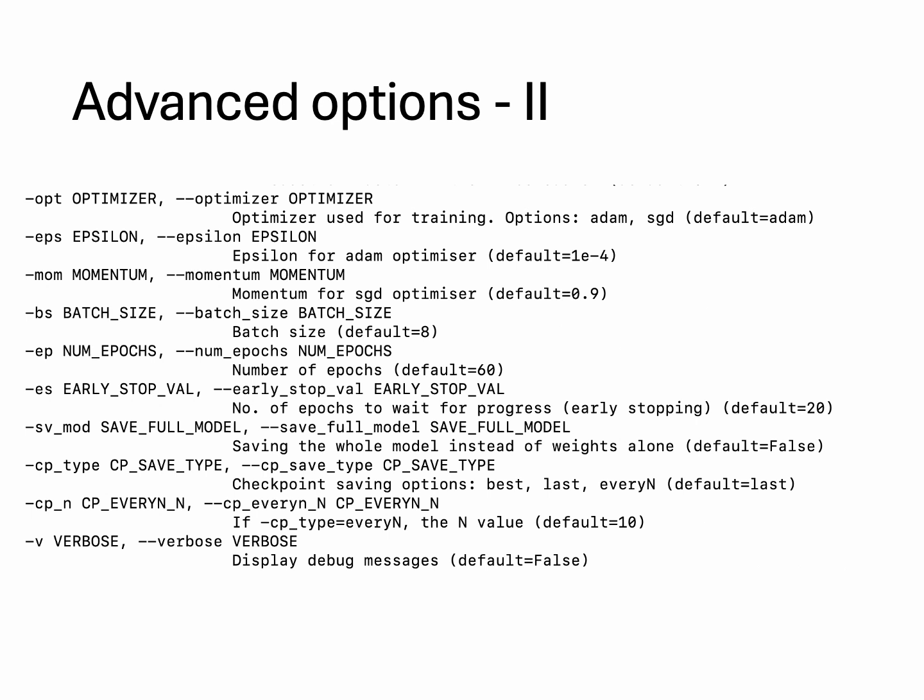So the default option we use is essentially the last model that's saved. If you want to save the best model, you can always change it to best, right, when you use early stopping. So the default patience value is 20, which means it will wait for 20 epochs before you actually stop training. Otherwise you can keep on going. So if you are not familiar with these options, completely disregard what I'm saying, leave it at default, and please run the model. It should be fine.